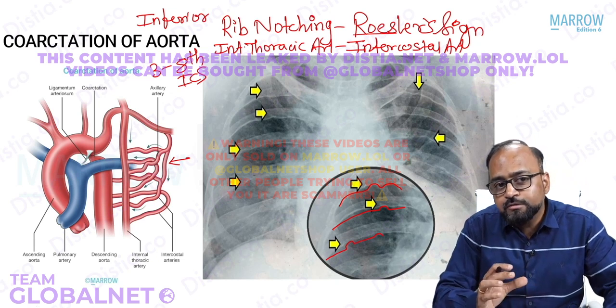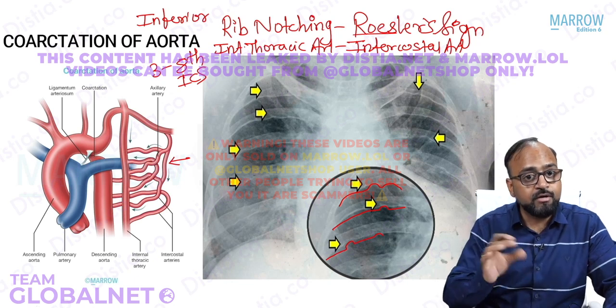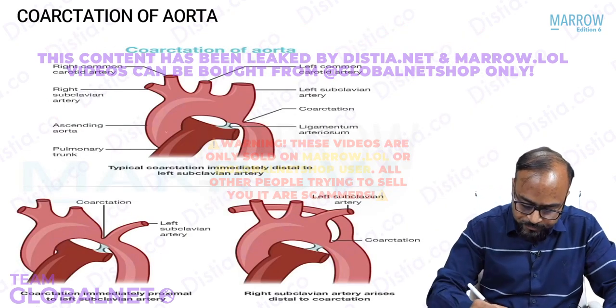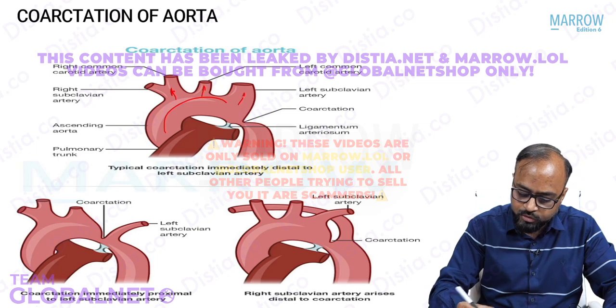Now, a difficult type of question could be asked in your exam based on where collaterals are seen, whether they are seen bilaterally or unilaterally, in certain specific clinical situations. Now see, this is the aorta. You have the brachiocephalic, the left common carotid and the left subclavian.